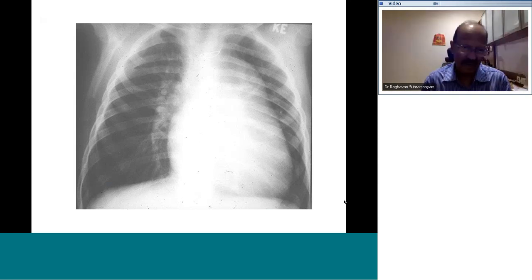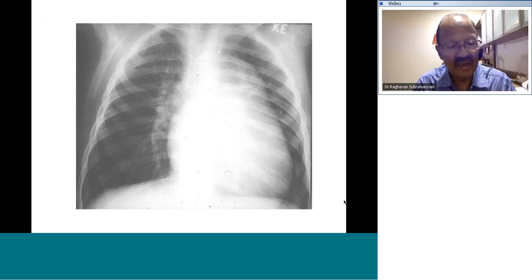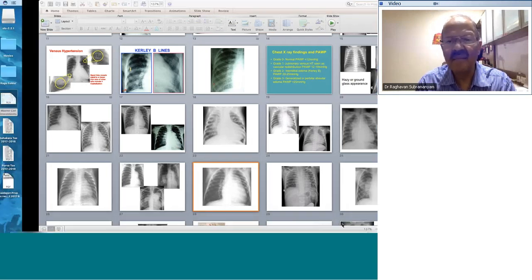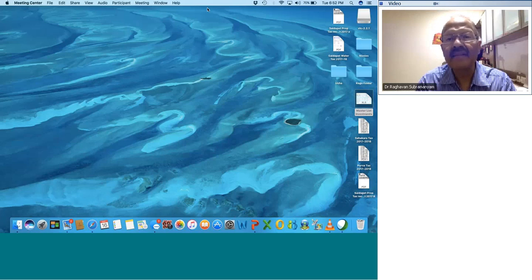What does this X-ray suggest to you? Yes, I want some answers quickly so that I can talk. Yes, please. Answers for that X-ray.